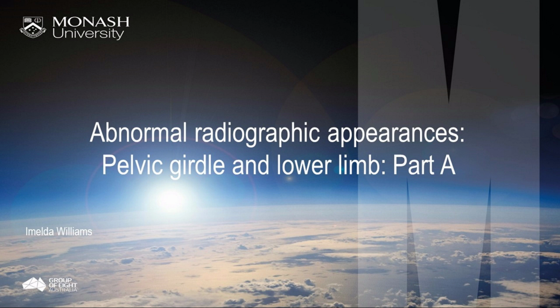This presentation will focus on abnormal appearances of the pelvic girdle and the lower limb. I've separated the presentation into three parts. Part A will focus on the pelvis and the hips. Part B will be on the femur, the knee, and the lower leg. And Part C will be on the ankle and the foot.